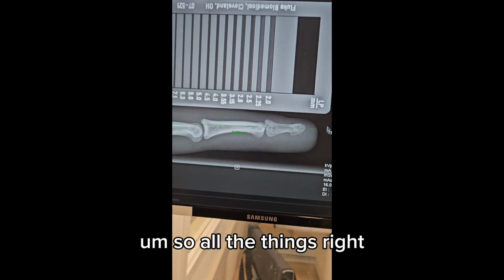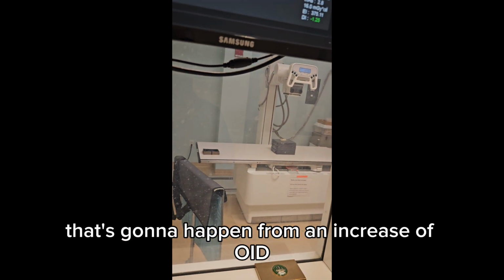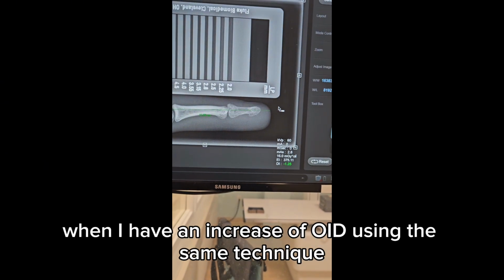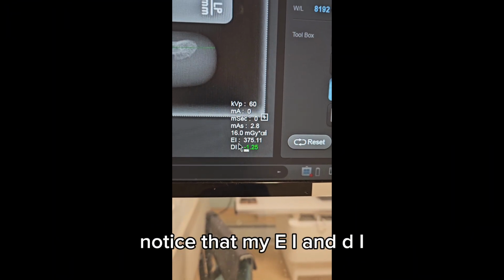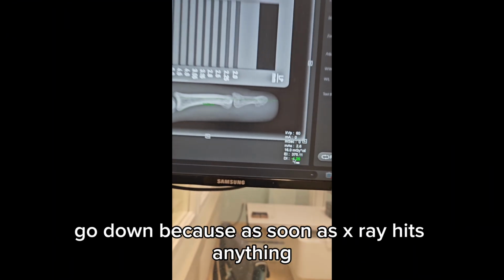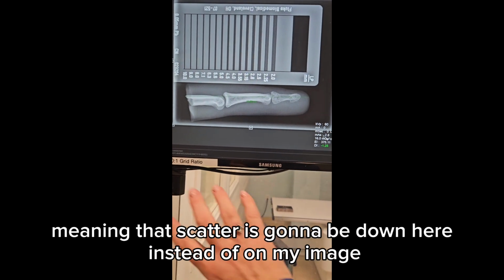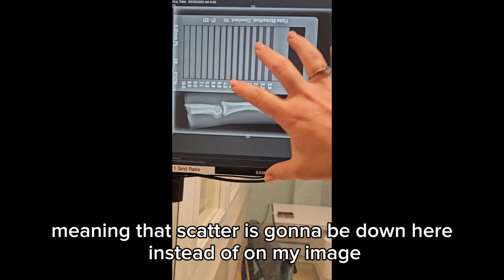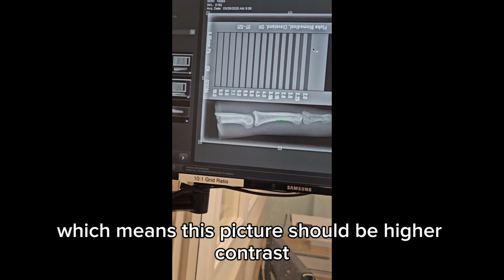So let's talk about all those things that are going to happen from an increase of OID. When I have an increase of OID, using the same technique, notice that my EI and DI go down, because as soon as X-ray hits anything, it scatters and misses the image receptor, meaning that scatter is going to be down here instead of on my image, which means this picture should be higher contrast, shorter scale, right?